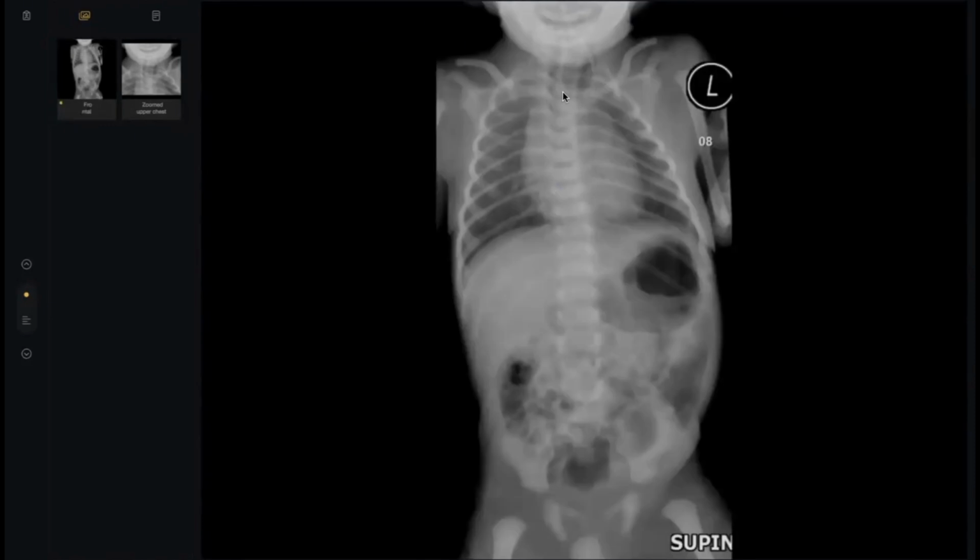Anatomical location. Throat, trachea. Not trachea. This is a nasogastric tube. So it's at the area of the epiglottis. No, the nasogastric tube from the mouth to, not to trachea, to something.